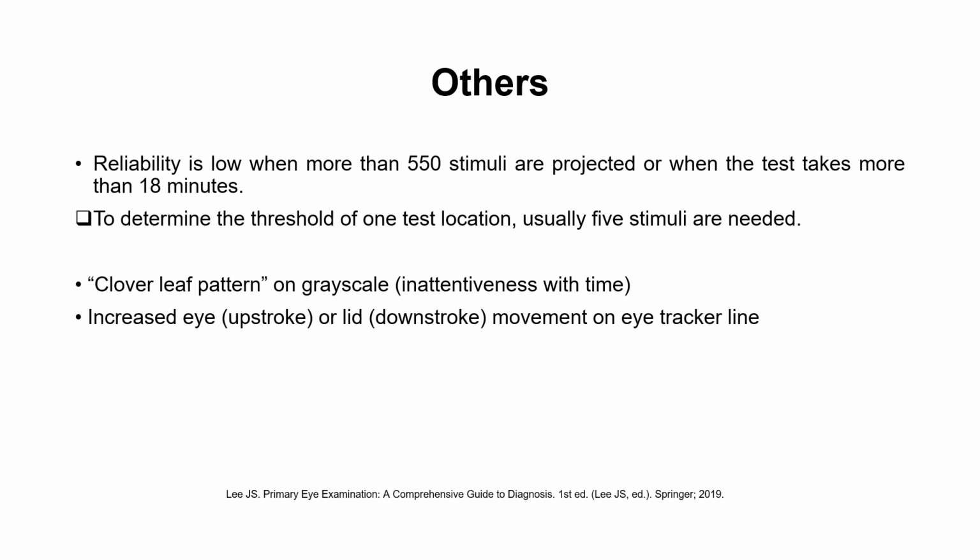So if you see that more than 550 stimuli are projected, or the test takes more than 18 minutes, it means that the reliability of the test is low.